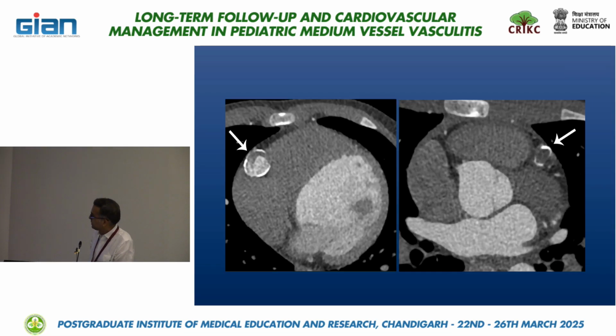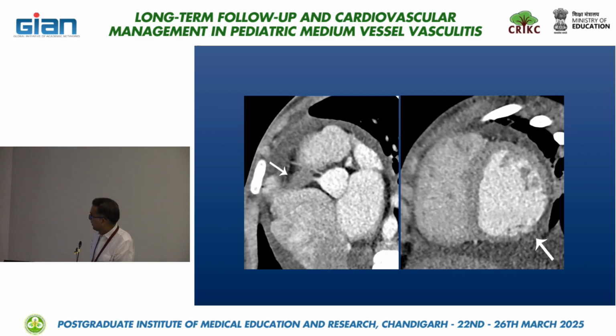So these aneurysms may show peripheral thrombus. There may be thromboembolic complications, or it may calcify peripherally with central occlusion. Then we have to see for the effects of this thrombus. So we also have to pay attention to the short axis images, which I already told earlier, to see for the effects. If there is chronic ischemia, there will be wall thinning along the particular territory. If this is the thrombosed aneurysm in RCA, and this is the thinning along the inferolateral and inferior wall in the mid cavity region.